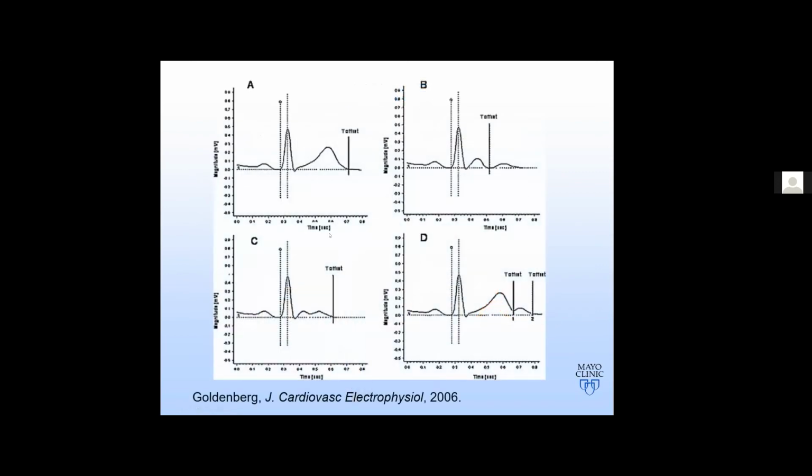So if you take a look, there's a deflection after the T wave, this is a U wave, okay? So in general, if the U wave is part of the T wave, or it kind of is molded into the T wave, then you should include that in this correction. However, if there's a distinction between the T wave and the U wave and it comes completely back to baseline, you should not include this U wave, because the U waves will frequently fool you that the QT is too long, and the computer will always include this.